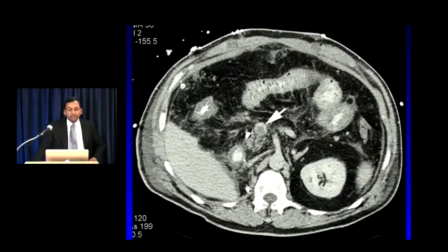So here's an example of a venous occlusion, and notice how the findings here are much more obvious, right? There's clearly thrombus in the SMV, but notice that these bowel loops look horrible. They're thickened, they're hyperemic, there's lots of mesenteric fat stranding and edema. Not a difficult diagnosis. Everyone is going to notice the abnormal bowel. What people tend to miss is the fact that there is that clot within the SMV.